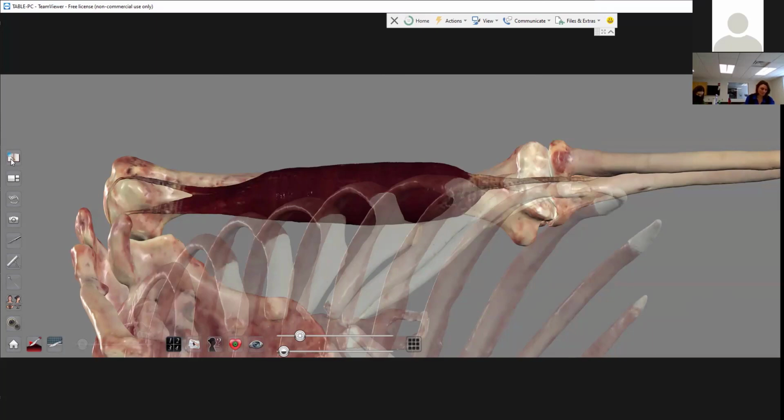Okay, so in terms of all of the structure, the main features of gross anatomy, that is about all of them that I like to make sure we go over. If there's anything you want to see, we always encourage you to take some time to play around with it while I'm still here in case you think of any questions, or if you want to see any physiology or anything like that. But this is all the gross anatomy stuff that we like to cover, I'm pretty sure.